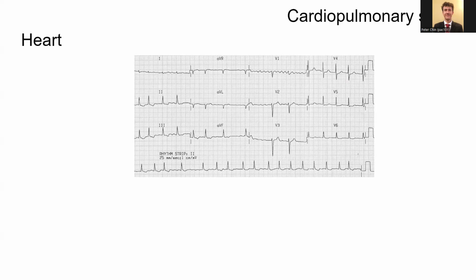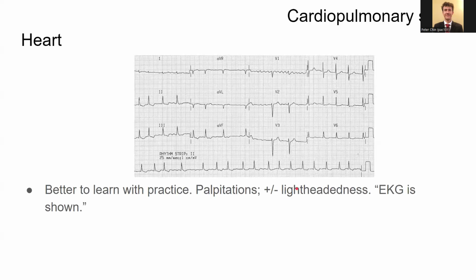Obviously, in real life, you're going to see the patient first and get a history and do a physical before you get the EKG. But let's be honest, if you're flipping to the next question on a shelf or Step 2, the first thing that you're going to see is an EKG. So yeah, like I said, better to learn with practice.